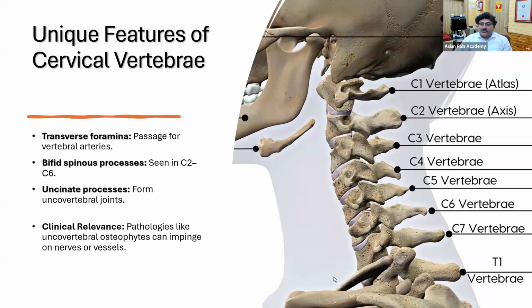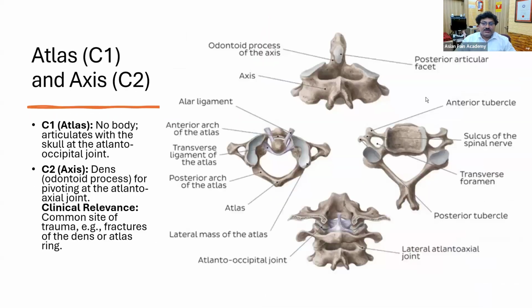And to look at it under fluoroscopy, you have to look at it in a view where it is oblique and at a slightly inferior angle. So that we will learn with time. Okay, let's move to the next slide.